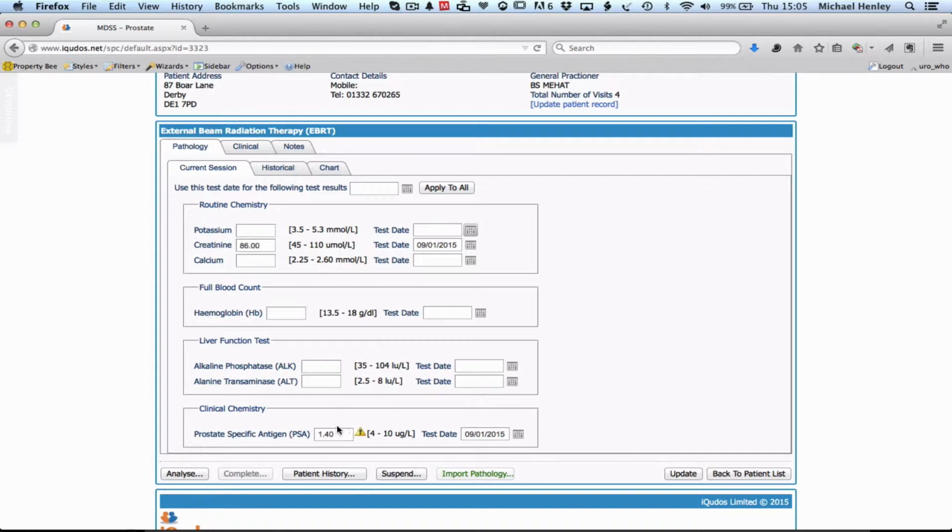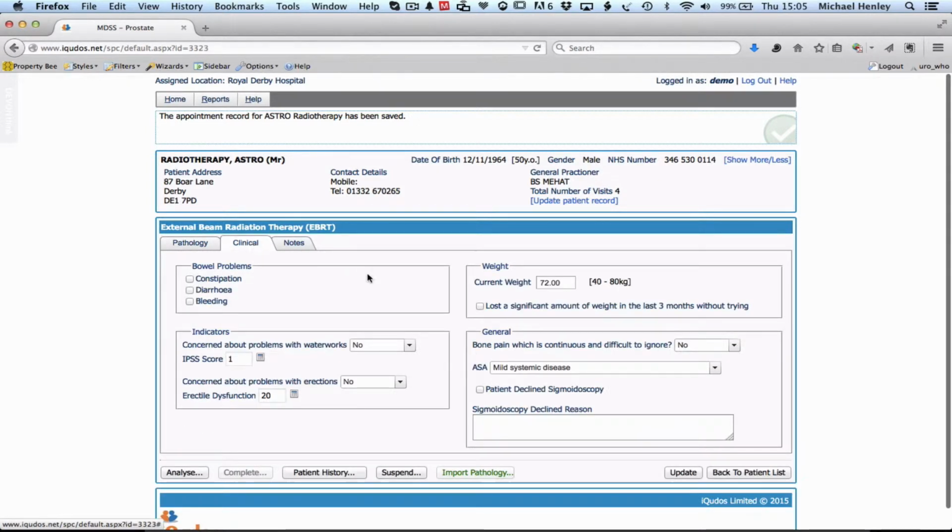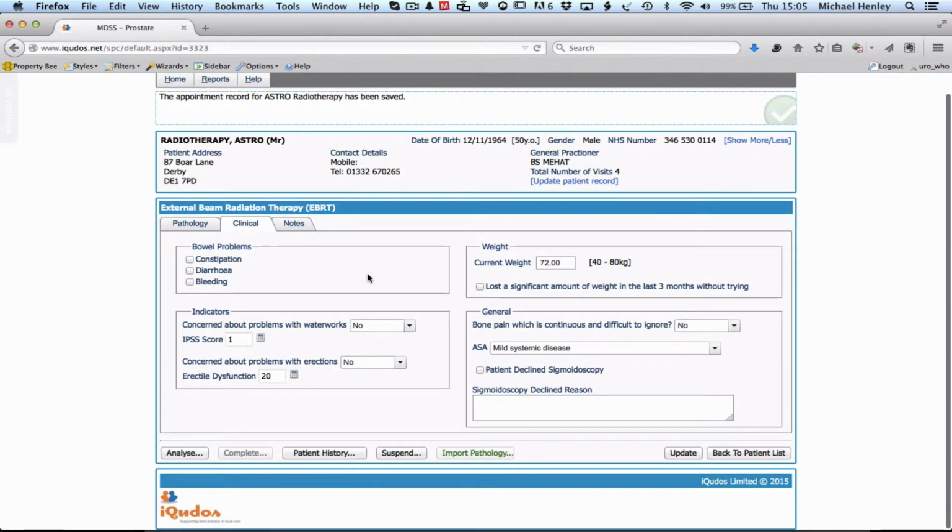So let's assume you type that. Let's change it actually. Let's type it in and put 1.6, and then we'll just click on update because we've changed something on the interface. And we'll just wait for it, and it'll accept that change. There we go.